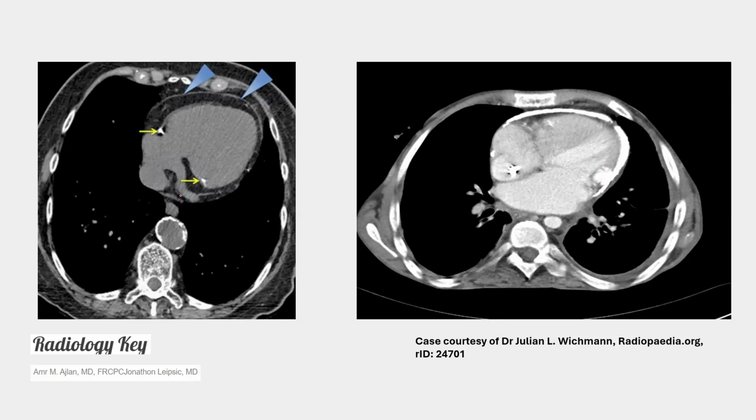Good? But what are we seeing here? This calcification relates to the coronaries, circumflex and RCA, okay? So in cardiac CT, you can know about the pericardium the best way possible. You can know the thickness, the calcification, the extent of calcification, the depth of calcification, all of that, okay? But as far as the hemodynamics of constriction, echo is the way to go. Echo. Hemodynamics of constriction, echo. The state of the pericardium, cardiac CT.